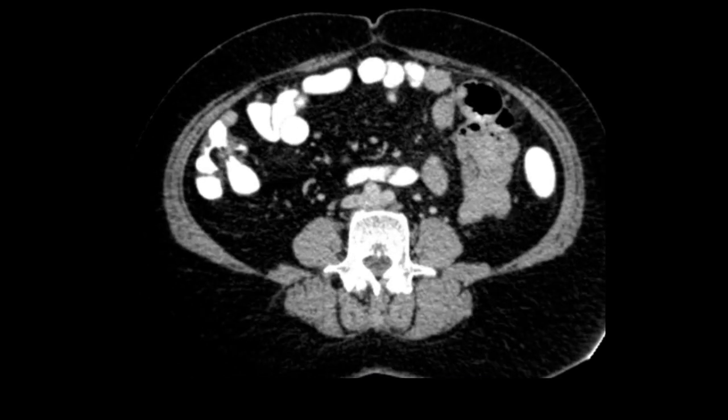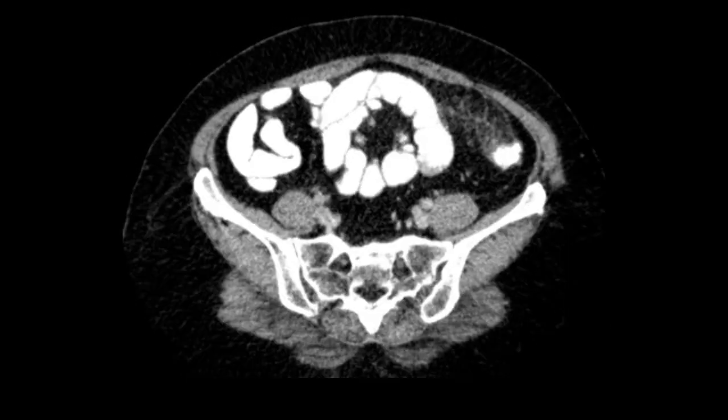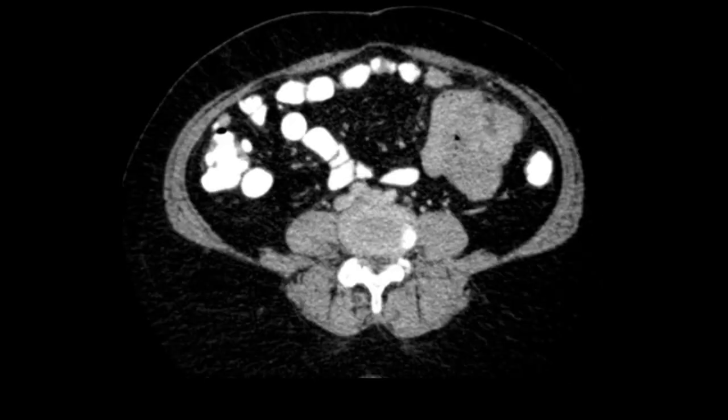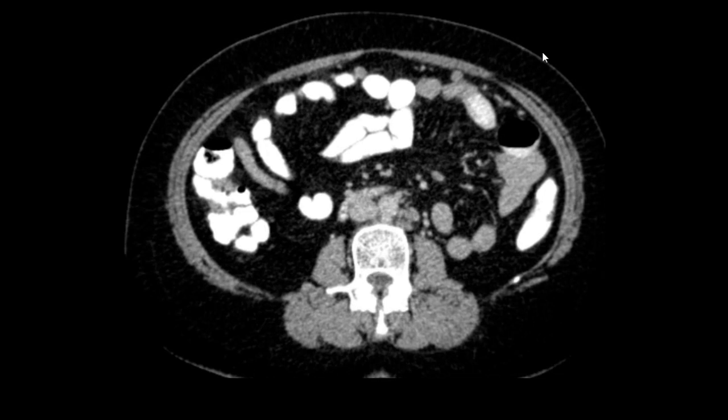So we have many cases like this, but I hope the gist of this talk is very clear, that view the scans on console, trace the entire colon and rectum, see the relationships of hepatic flexure and splenic flexure, identify the thickenings and the diverticula, look at the appendix, see the relations of these structures. When you are assessing the cancer scans, also look for metastasis and the nodes.